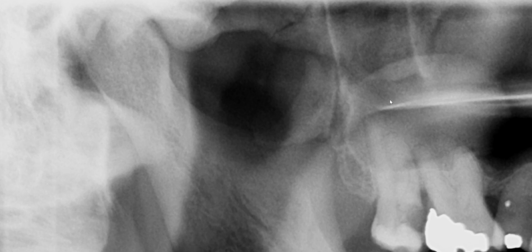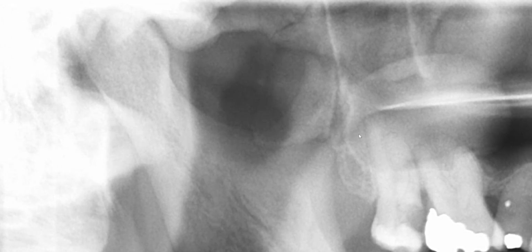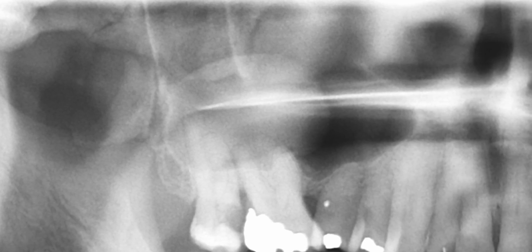This can be a little bit tricky at the predoctoral level, and this could be better answered if I adjust the contrast a little bit. Okay, so I think this is a good contrast level to make my point. So without giving you the answer yet, I want you to still come up with potentially another differential diagnosis before you make up your mind. Now let me go over to the other side, because it's always nice to be able to compare to the other side.